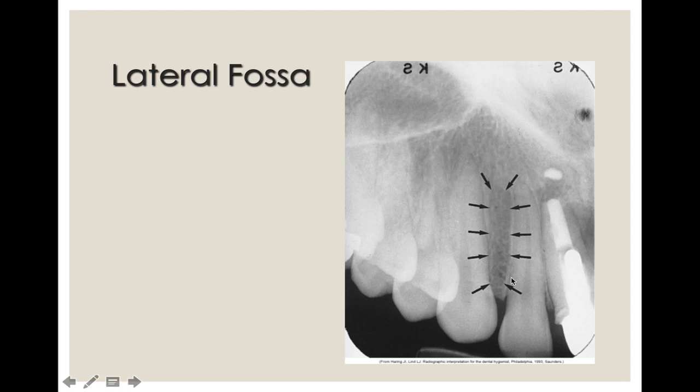So you'll notice this here on radiographs, and you want to be sure to know what this anatomical landmark is, not because it's necessarily an incredibly important landmark, but because you want to know that you're not looking at any pathosis. This radiolucent area you may think looks like something abnormal because it appears different than the bone surrounding it, but it's important to know that it is not. If I were to look at this radiograph on my own, I wouldn't be looking at the lateral fossa. I'm looking over here. I notice here on this root canal, I definitely shouldn't be seeing this radiolucency here and then radiopacity almost above the apex of that tooth. So if I were to take this radiograph, I would definitely be concerned about this tooth. So you want to be looking at the whole picture.